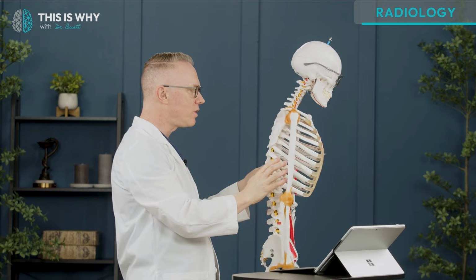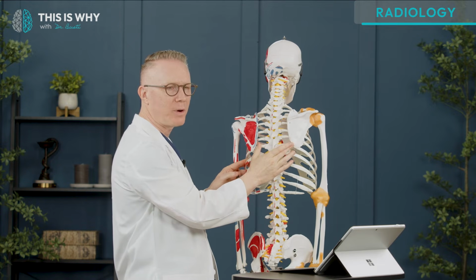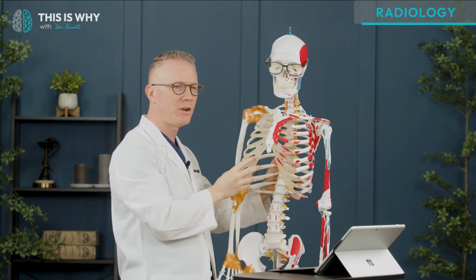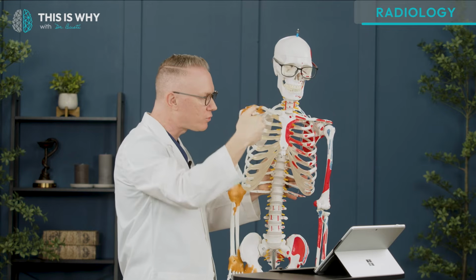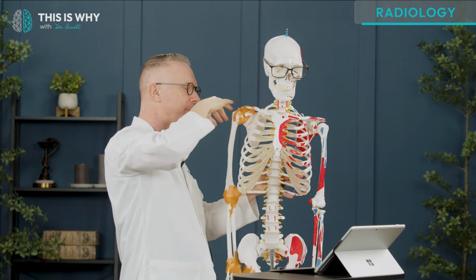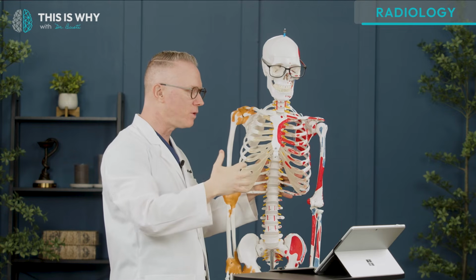Well, if you can notice that if they're laying in bed and their arms are not extended out, the scapula actually sit in part of the lung field. That becomes very important here in a second when we look at an actual x-ray. But if I turn you, Bro, here even forward, you can see that the scapula make up a portion through the rib lines, because you're having to look through the anterior and the posterior ribs, but you also see the scapula. But if I move the scapula around on each side by changing the position of the arms, I can move the scapula from the view, okay?